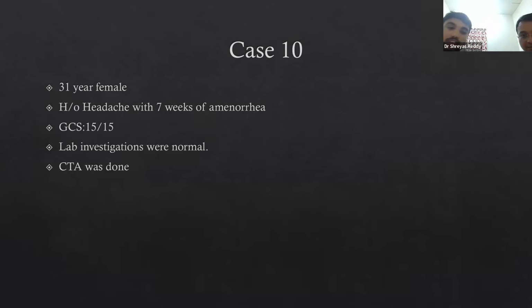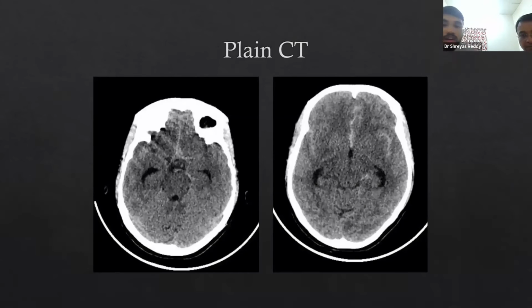So as you can see, there is hemorrhage in the bifrontal region as well as the interhemispheric fissure, also associated cerebral edema in the involved area. Yes. So interhemispheric fissure has a bleed inside.